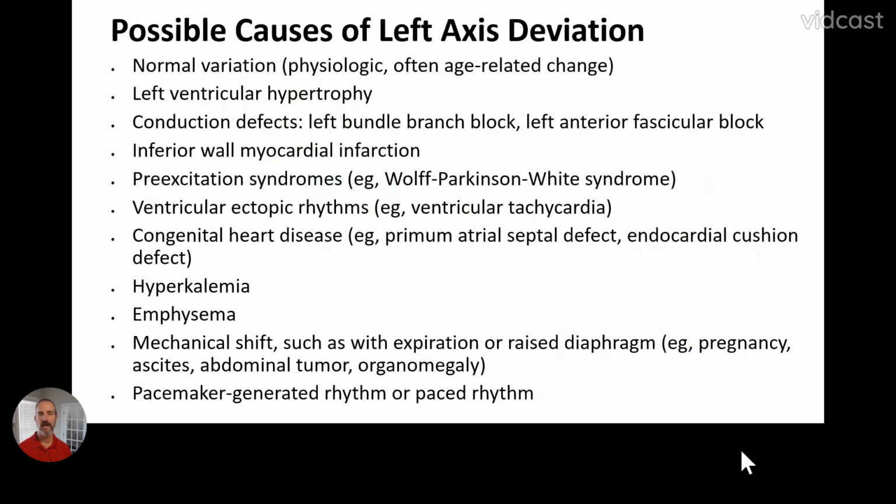So why does someone have left axis deviation? You can pause the video and take a look at those different reasons.